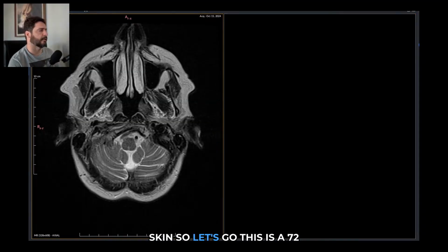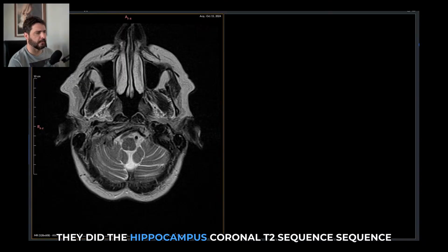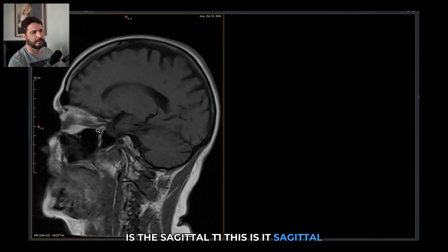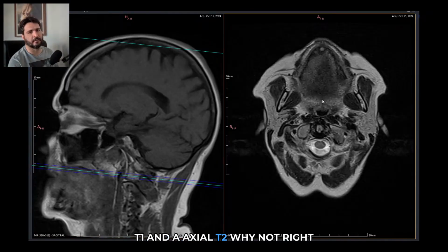So let's go. This is a 72-year-old female. She says she has some memory loss. It's a brain MRI. They did the hippocampus coronal T2 sequence. And let's go for a sagittal T1. Where is the sagittal T1? This is it. Sagittal T1 and an axial T2.